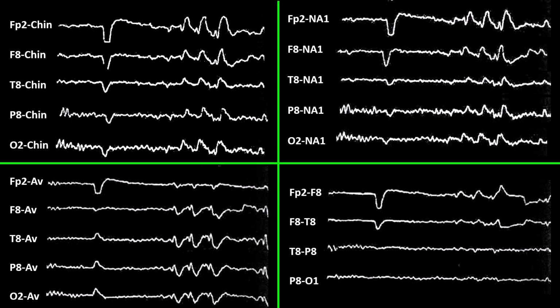In this frame, as you can see, I have placed the same epochs viewed by the four montages so you can appreciate the effect of the different spatial filter capabilities of the montages upon a broad potential as the one shown in this frame.